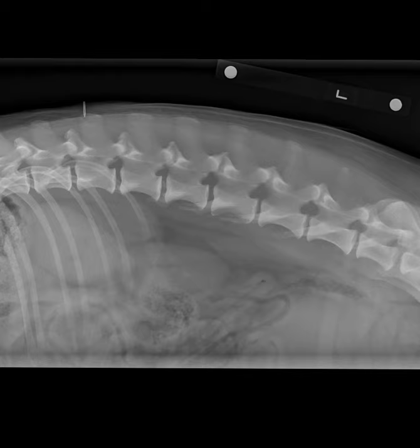While you're looking at the lumbar and caudal thoracic spine in this dog, I'll mention that for a case like this, the neuro and physical exams and your clinical database are really important. But often we would consider a differential list like intervertebral disc herniation, fibrocartilaginous embolism, trauma, neoplasia, or infection such as discospondylitis. So the role of radiographs in a case like this is usually as a screening tool to exclude a vertebral neoplasia, aggressive lesion, or discospondylitis.